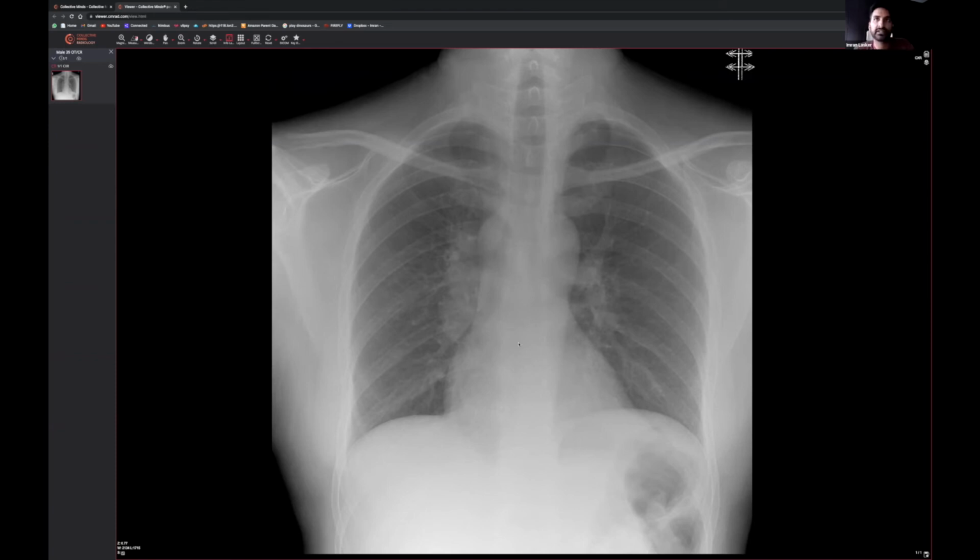So this one is a young patient, and they have got this chest X-ray. They've come in, and they are fairly young because you don't really see much in the way of calcifications in the sternal area. If we look at this, at first it may look like it's okay, but my check area is always going to be the costophrenic angles. These areas here look very, very sharp. They look fine. Lung apices, they look okay.